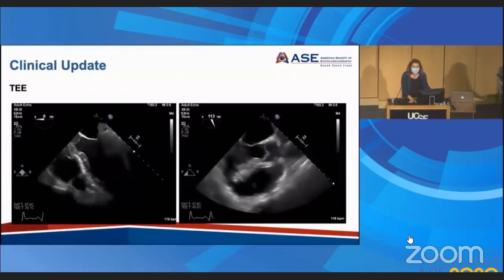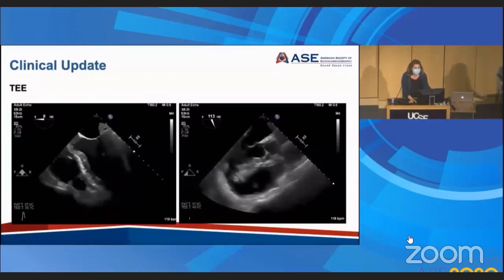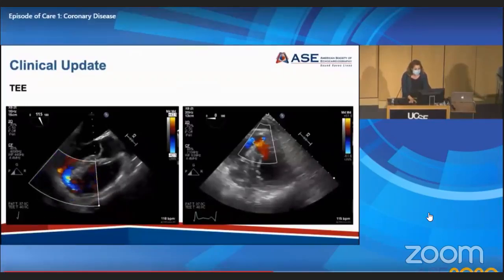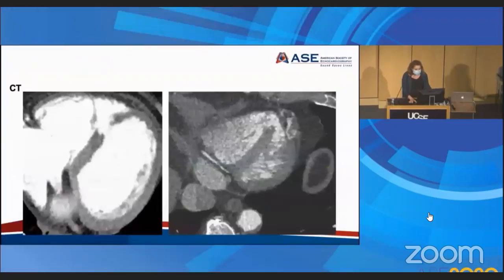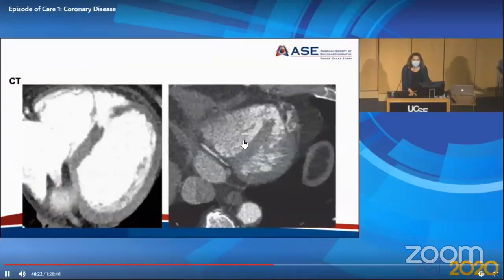It's appreciated near the apex with ongoing akinesis of the basal to mid-inferior wall, as well as the basal to mid-inferoseptal wall of the left ventricle. Again, we see the color flow prominently left to right. Finally, we have some CT images of that muscular ventricular septal defect.